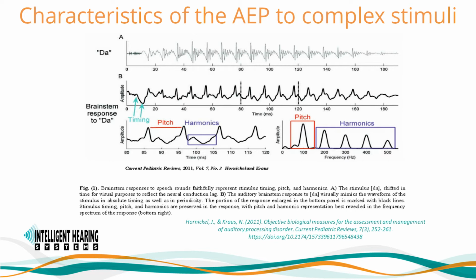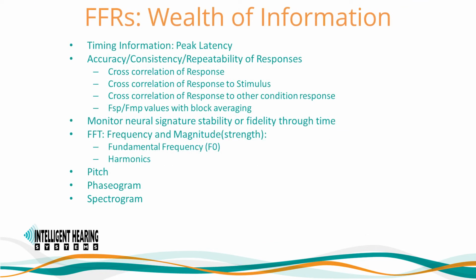Segmenting a portion of the FFR response, 80 milliseconds to 120 milliseconds, we can zoom in and measure the strength and magnitude of the pitch and harmonics from the frequency spectrum. Thus, FFRs provide a wealth of information.